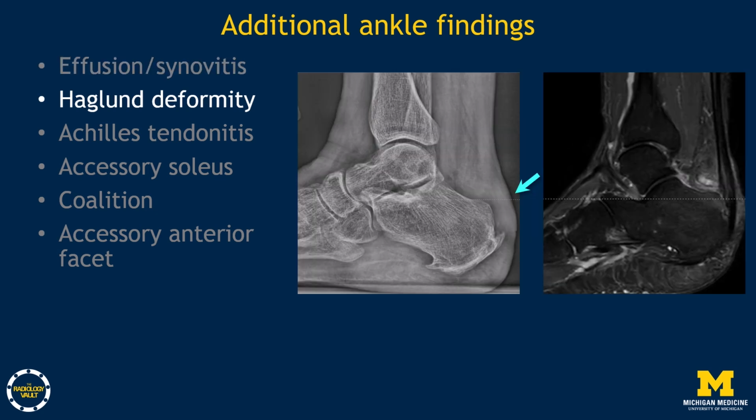This patient has swelling of the retroachilles bursa and moderate thickening of the distal Achilles tendon, with edema of the calcaneal tuberosity on the corresponding MRI. In some patients, a prominent bump of the calcaneal tuberosity is the etiology of these findings.